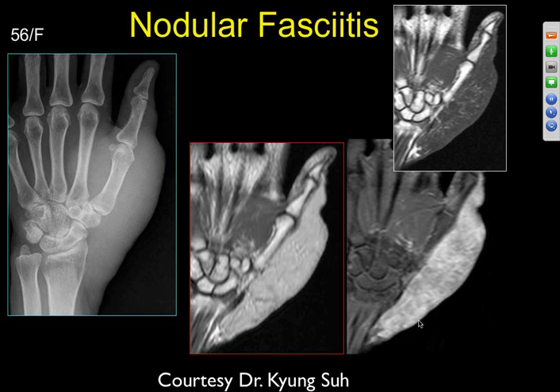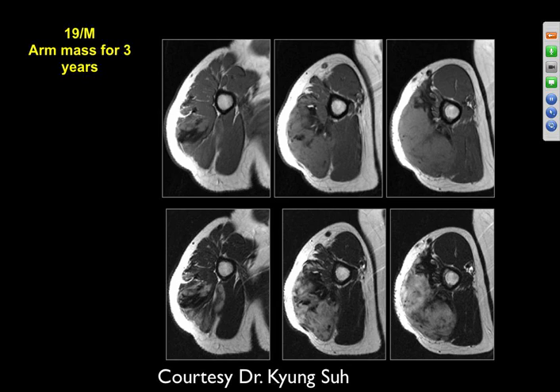Could do this. Yeah. Again, I think a lot of things could do it. The fact that it's as low as it is on the T1 weighted image, but it gets bright, I think this could be a lot of different patterns. Certainly, it's something that I think you'd have to be very concerned about. It is large without necessarily a lot of involvement of the bone, but I would certainly be concerned about a malignant lesion here, though this turned out to be benign.